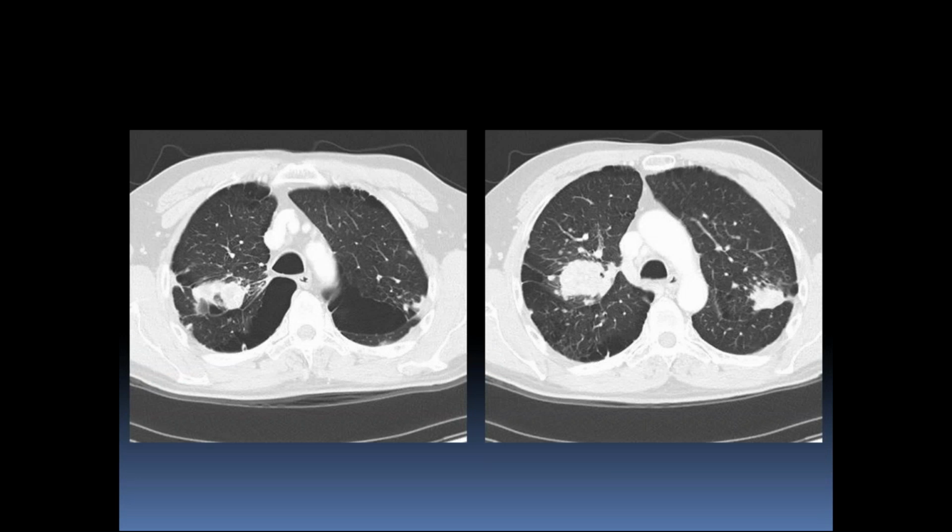Now, getting into this other form here, on a different patient, you can see the cicatricial changes or emphysema that are peripheral to the progressive massive fibrosis, which is what these things are called. I don't remember exactly what the cutoff is, 1 or 2 centimeters, probably 2 centimeters or something like that. When some conglomeration gets this big, they start to call it progressive massive fibrosis. So the cicatricial emphysema occurs peripheral to that, and if one of these bursts, you get a pneumothorax. So it's easier to remember the why rather than just memorizing the different things. You can see the bullous changes in the apices here as well.